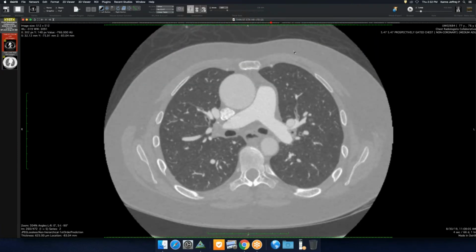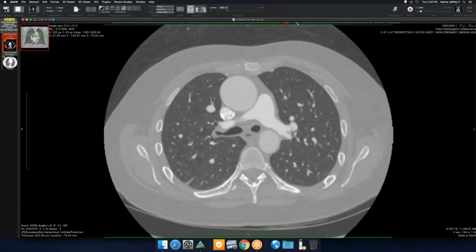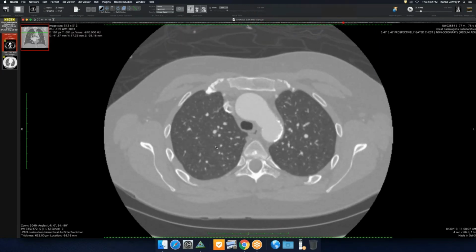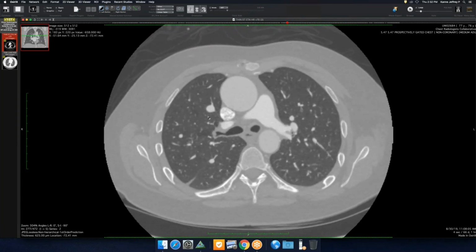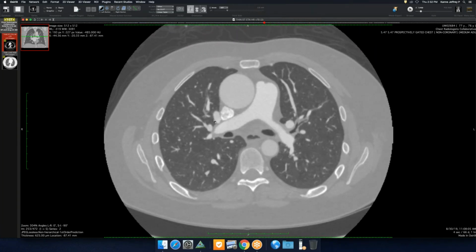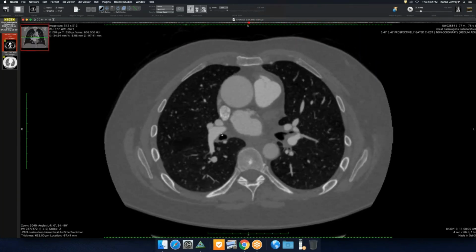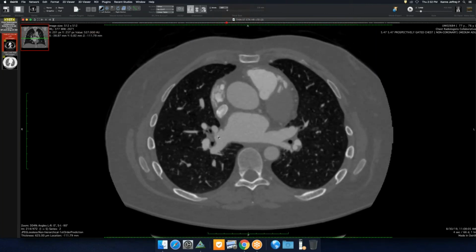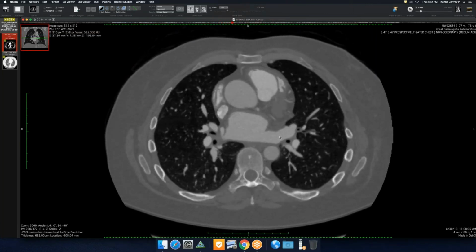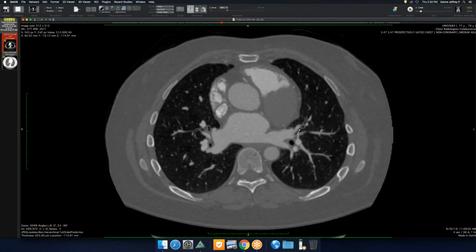And then to follow the rule of congenital, there's a nice funny looking vein here in the right upper lobe. You can see this funny vein. So this is a meandering pulmonary vein that comes way down. And what's cool about it is it comes into what looks like a common antrum to all the pulmonary veins on the right, just like we often see on the left. The 2 pulmonary veins come into this common antrum and then communicate with the left atrium.